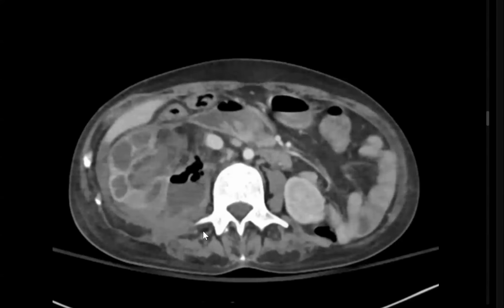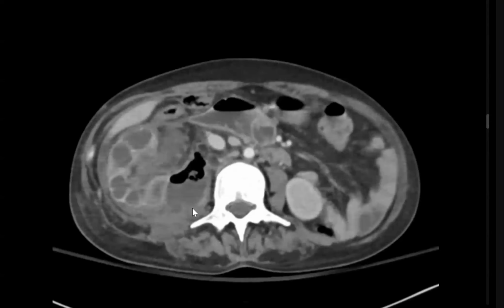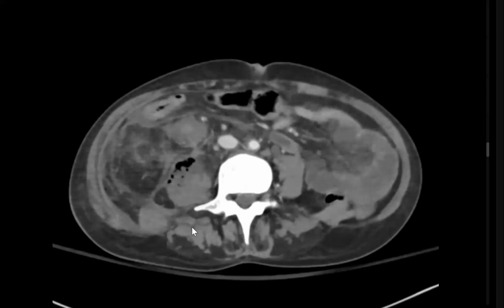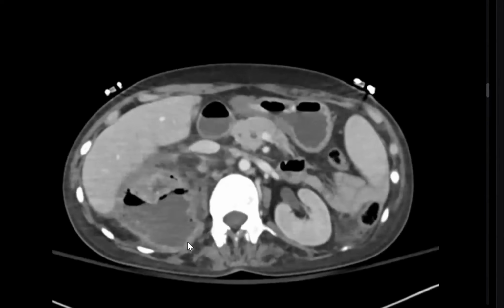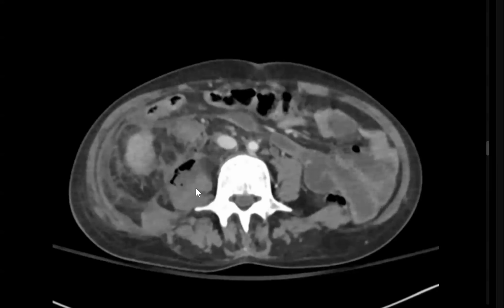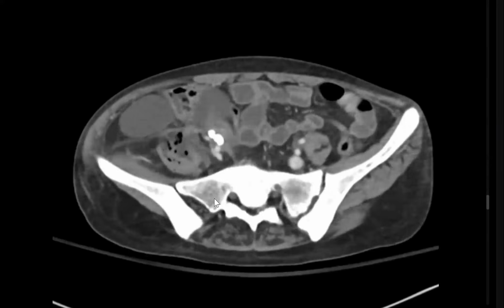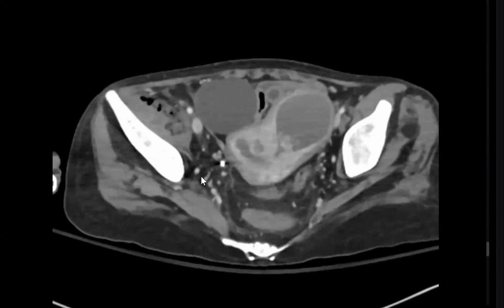Good. On top of that, you said atrophy of the kidney, yes, but the appearance of the kidney doesn't guide us to a certain diagnosis. I feel that there is a pelvicalyceal dilatation also. Okay, no problem. Downwards, there is something else. I'm trying to also see if there's extension to the ureters. What is this dense structure in the ureter?